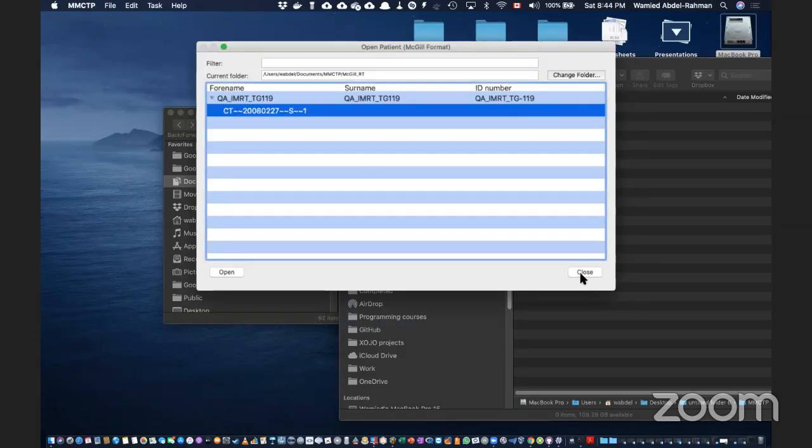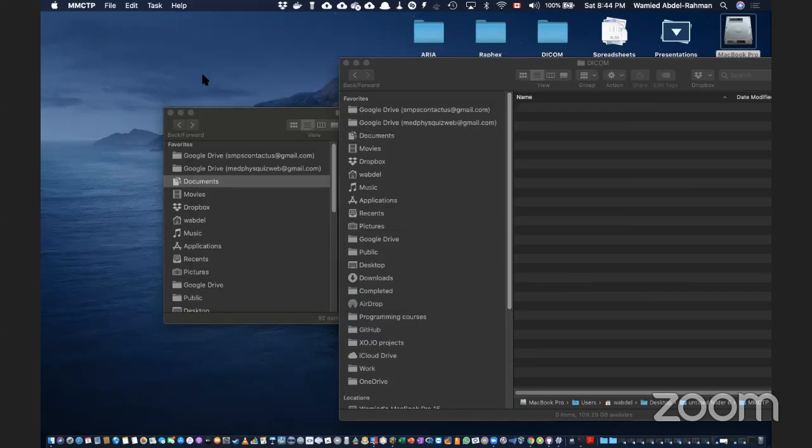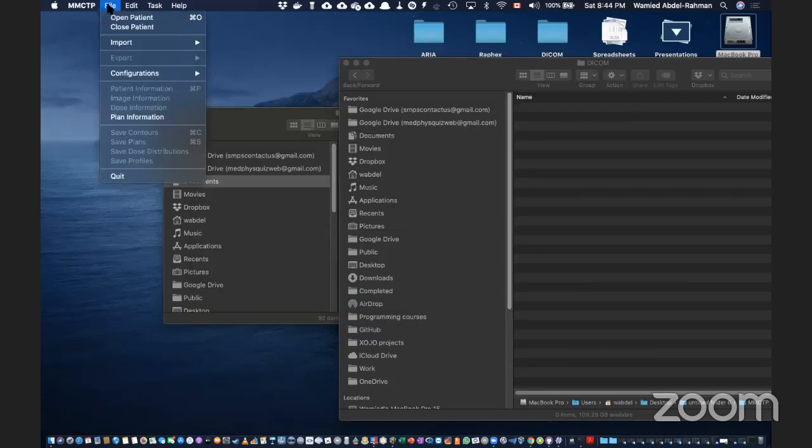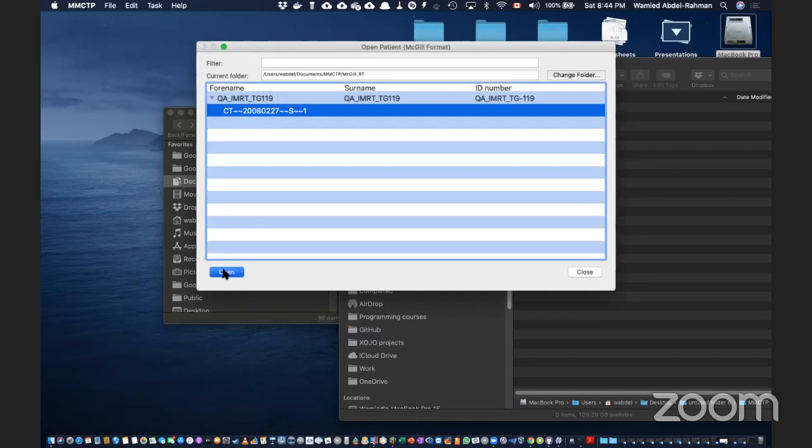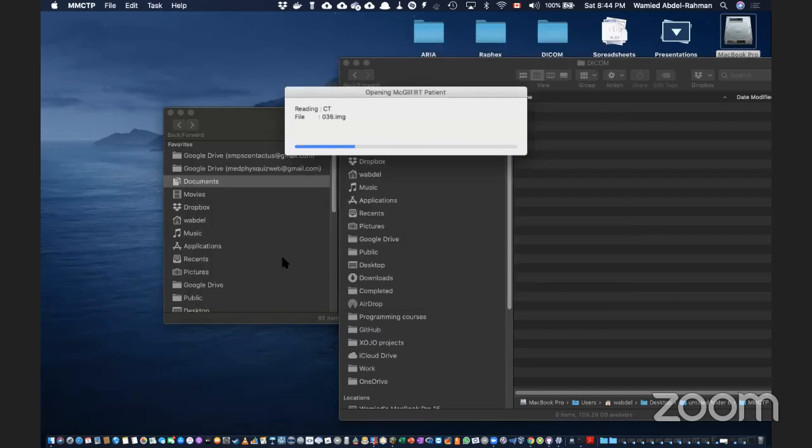There they tell you, okay, go and scan your phantom with a given shape and dimensions, and then we will import structures. They have drawn these structures for us. Then they ask us, okay, this is a structure for a prostate. Try to do a plan so that this prostate structure in that phantom gets this dose, and so on. This is not a patient, because I don't want to show patient images, so the best example is to show you a phantom.